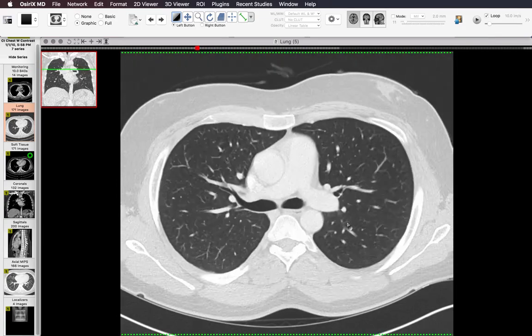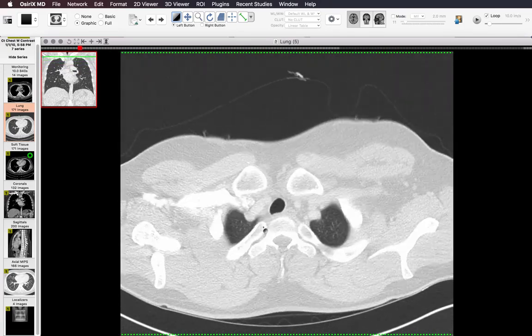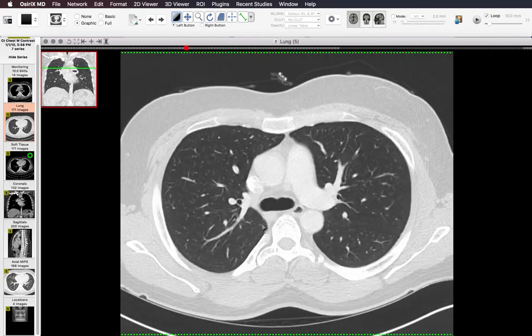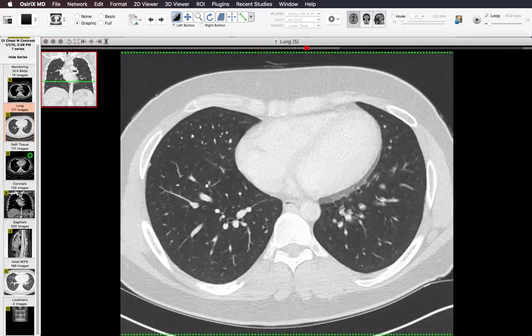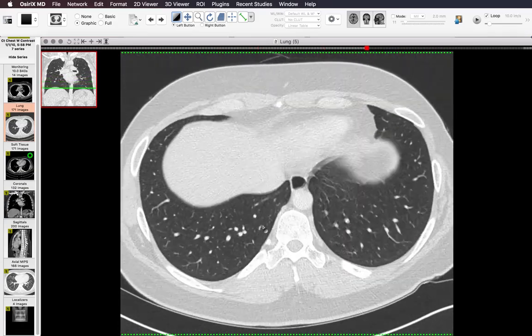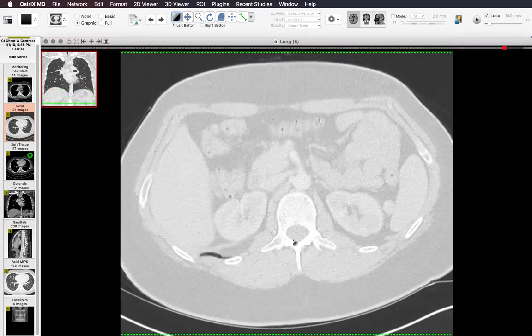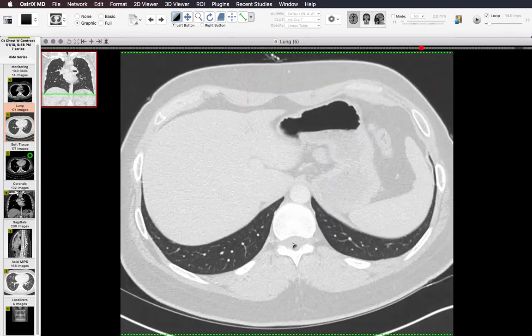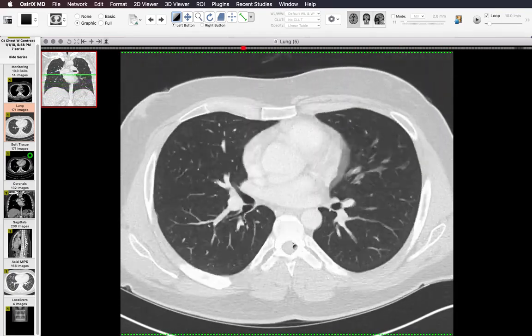Once I've cleared the airways, then I look at the lungs. Now, I do two different passes of the lungs. The first is I look at both lungs looking for big things like consolidations or masses or large areas of ground glass opacity. This is sort of my macro search for disease. And I could tell already that this patient's lungs are basically normal. And the second pass that I do is a more fine pass looking for lung nodules.